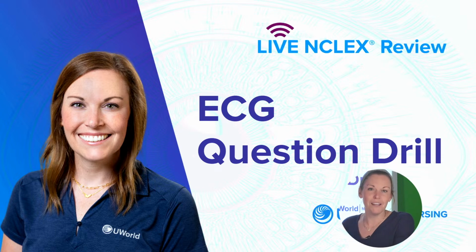We are covering one of the most requested topics, so we're going to be covering ECGs today. We have about 8 questions we're going to go over. Each of them includes a different ECG strip for us to interpret. We're going to focus on the correct answers only so we can really talk about how to digest these strips and make sure we understand what's going on with all of them.